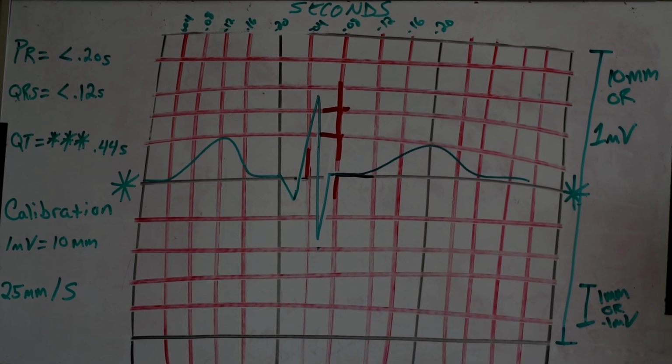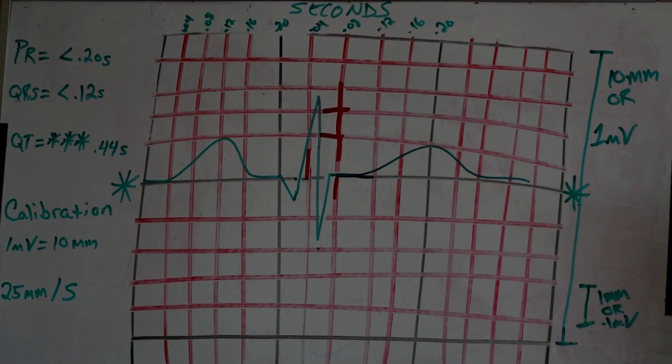Now, sometimes the EKG machine, when it gives you the EKG, will give you an interpretation, but you always should have that read by a cardiologist or MD on top of that. Never take just the machine's word. So, two important things to know when you're looking at a sheet of EKG paper is it always should be calibrated for voltage and for speed.